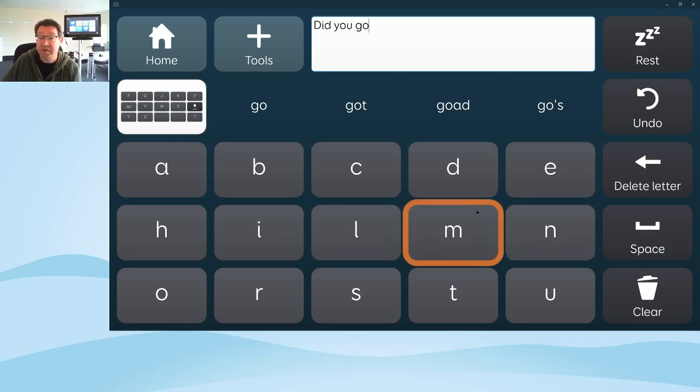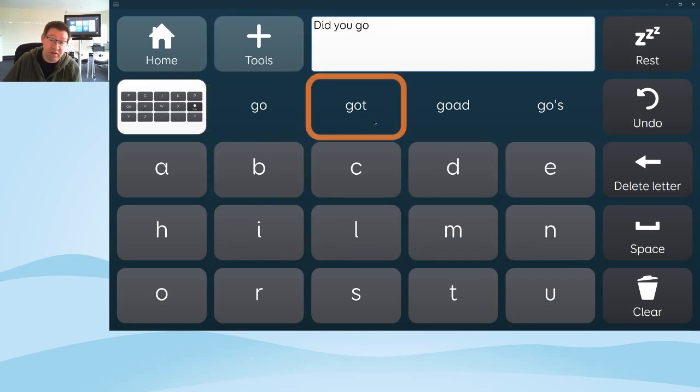So that hopefully gives you a flavour of some of the differences between the two. But as we're going on this tour of Fast Talker this afternoon, I will show you some of the features within this grid set and some within standard Fast Talker. The whole feature set actually is the same in both versions. You can do everything in both versions.